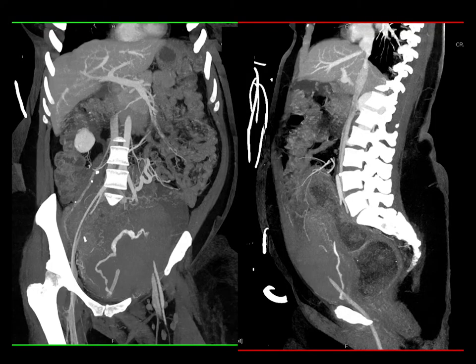So I will also mention, as we speak about incidental findings, bladder cancers are commonly incidental findings. And especially if someone has hematuria, that makes it not incidental, you've got to look carefully. You've got to look for small tumors, even 1 centimeter or less. Anything in the bladder wall enhancing will be a tumor, almost 99% of the time.